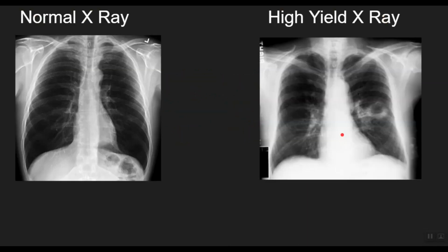Let's look at another important x-ray. Let's suppose a 55-year-old chronic alcoholic comes to you intoxicated. You notice that his breath smells so bad, almost like a dead animal. He also has a severe cough with productive smelly sputum. On his x-ray, you see this particular pattern.